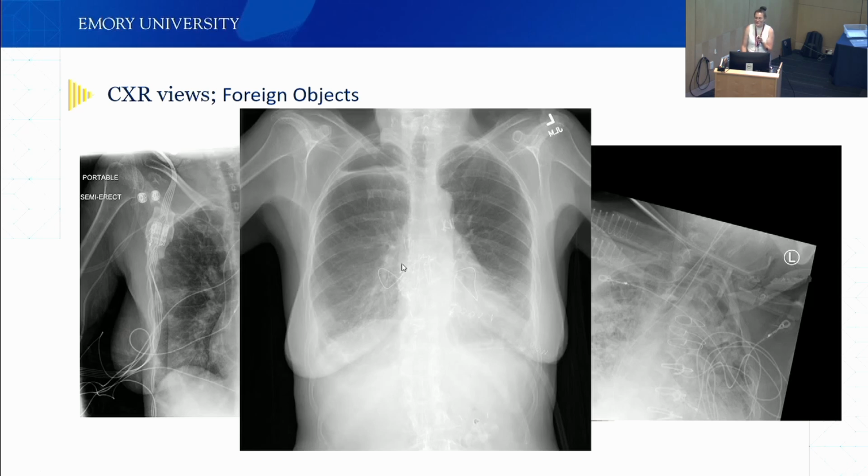Yeah, there are butterfly stitches. This patient had a lung transplant. So they're not the best to use for COVID prediction, because a lung transplant patient with COVID does worse, mostly also because they had a lung transplant. So sometimes there are very subtle things that you don't necessarily think are important. So it's good to have radiologists at least go over some of your cases. We added an "other" box with our labeling, so they could sometimes note these things.